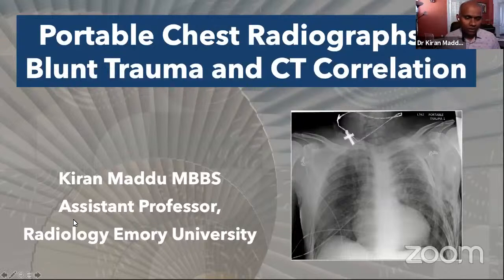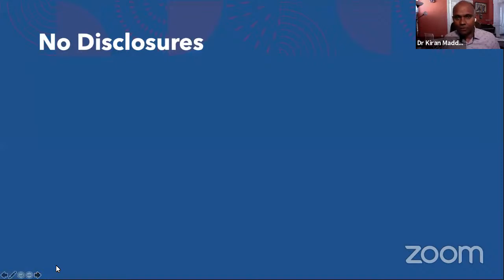The reason why I call them portable chest radiographs is that most radiographs taken in trauma are of patients who are not in a position to stand or cooperate with the ideal way of chest X-ray, which is the PA view. These trauma radiographs are mostly taken at the bedside. That's the reason why we use the word portable. It has its own limitations.